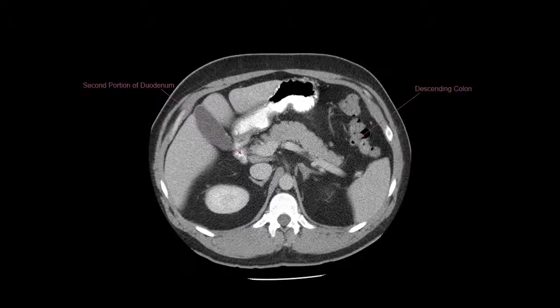Alright, A and D. You got your second part of the duodenum, so you can just note that there's small bowel running through here, and you got your duodenum running. Also, here's your descending colon, as we already noted before, with the splenic flexure, and then you're coming down, descending. Kidneys coming into view a little bit more as we go. Inferior vena cava sitting there, you got aorta sitting there. Splenic artery running across, and then you got your pancreas here. And again, gallbladder here.